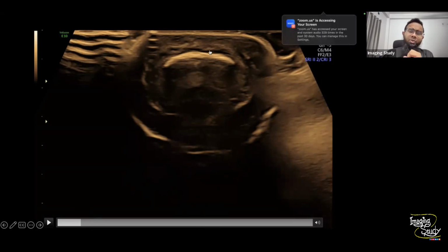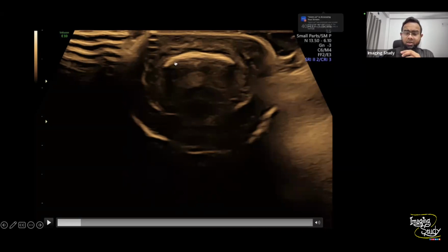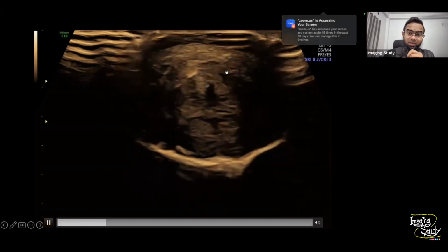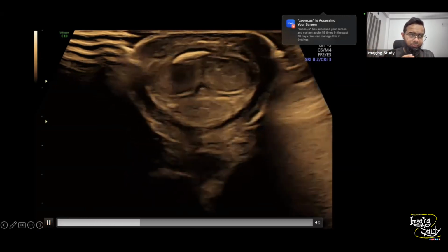This is the dorsal aspect. You see the corpora cavernosa. This area has the neurovascular bundle at this part. You'll see the deep dorsal penile arteries at this portion if you put the Doppler, and below that there will be a nerve passing through this area. So whenever the patient has this type of calcification at this part, it may compress the nerves at this point. So it will also cause difficulty during the erection procedure.